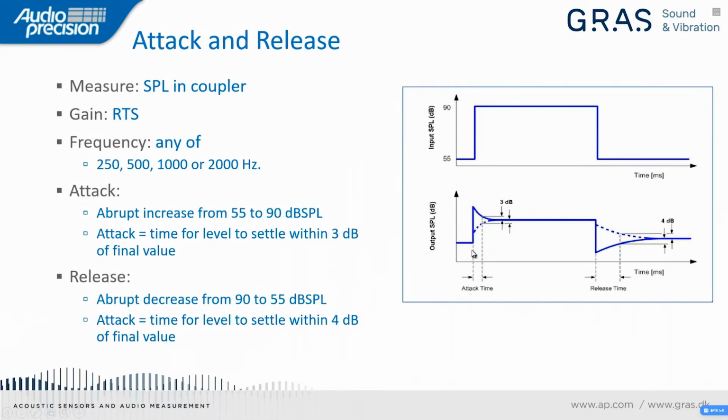Similarly, on the release side, we have a step decrease in level from 90 to 55 dB/SPL here. And we measure the release time as the time that it takes for the envelope of the signal to settle within plus or minus 4 dB of the final signal.